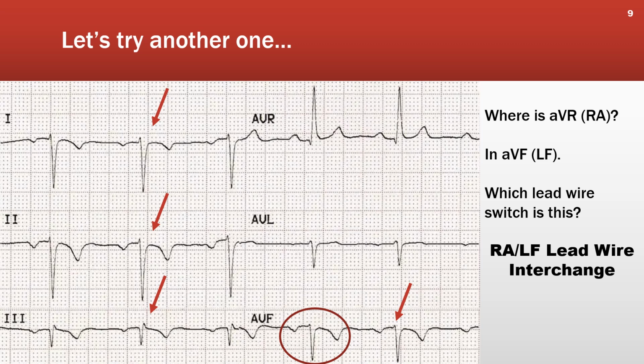The only issue here is that in leads 1 and 2, there's a tiny R wave, and in lead 3, the R wave follows the negative portion, so you have a QR morphology, whereas in 1 and 2, we have a small r, deep S morphology. However, these are not any kind of version of lead AVR.